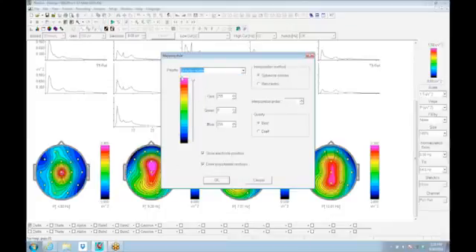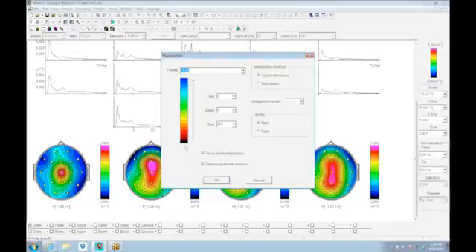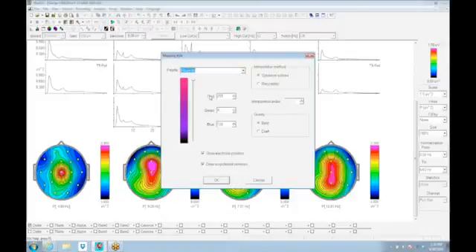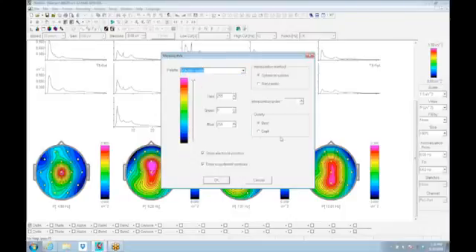I like the Roy G. Biv rainbow colors going to black for absence, and that's my preference, but there's lots of various color scales, red, green, blue, you name it. So pick whatever color scale you particularly like.